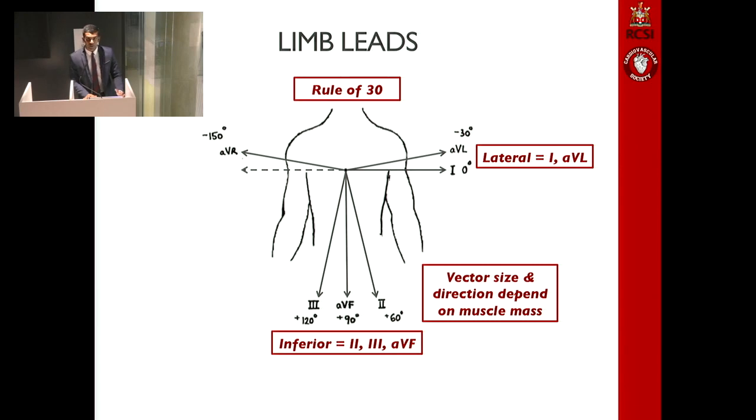It makes sense, therefore, that the overall cardiac vector is left-leaning. Although textbooks say that the normal cardiac vector lies in a range, let's assume for the sake of simplicity that it's in the same direction as lead 2, now highlighted in red.